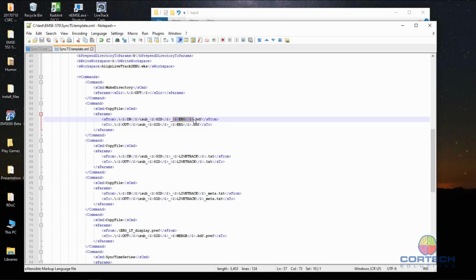So if we look then at what this line indicates, this first command is going to simply copy from the input folder to the output. You don't have to do that, but I just wanted to keep the input nice and clean, and we can practice. It's easy to get back to the starting point by deleting the output folder, which will end up having a lot of other stuff in it, and then the input folder will stay clean. So that's why I did it that way.